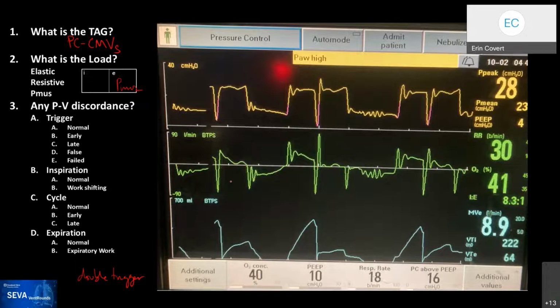This is a tricky one, Aaron. So let's walk together through it. I'm going to be asking you some questions, okay? I was walking in the unit, at 4 o'clock in the morning, and I saw this waveform. So me being me, I couldn't stop, took the picture, then fixed it. So let's talk a little bit.